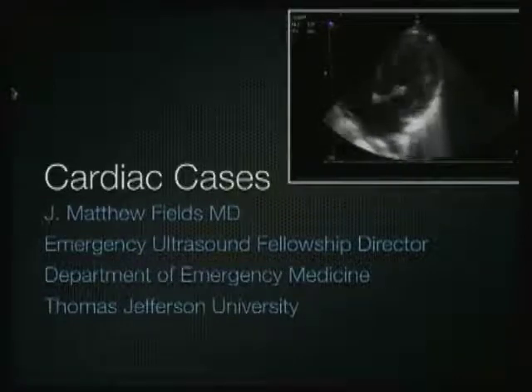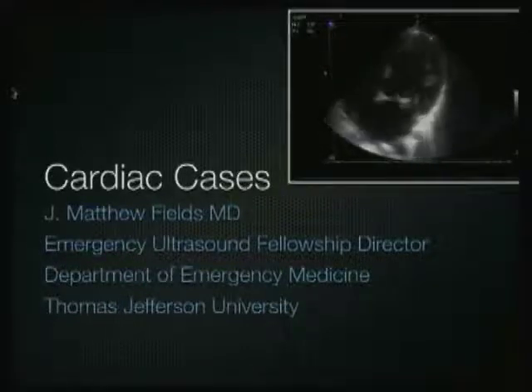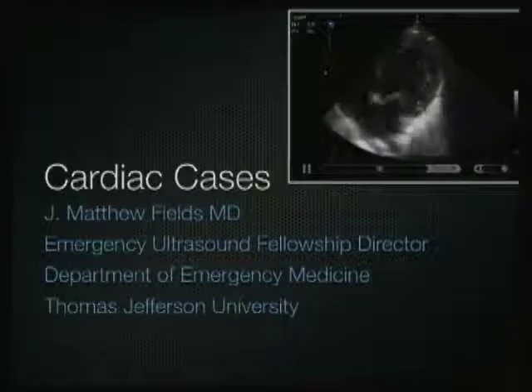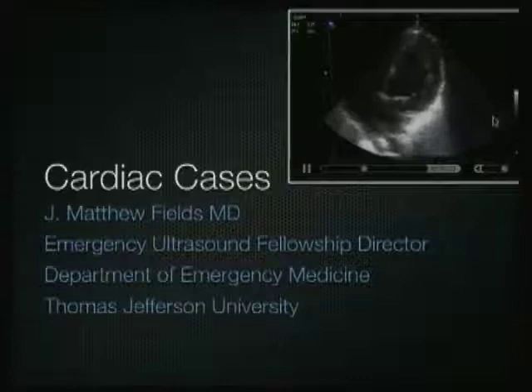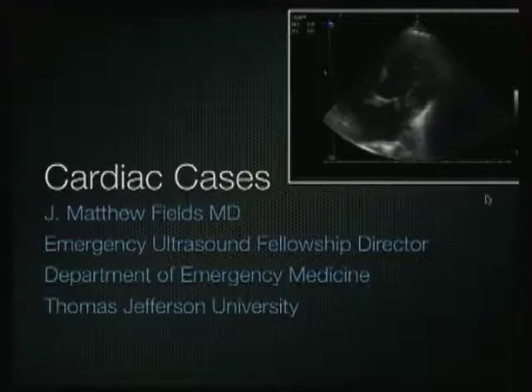For this example that I'm showing here on my title slide, just simply taking a quick look at this, hopefully you realize that there is something not quite right here, and you can see on the mitral valve a large hyperechoic mass, and this was a case of endocarditis. It's very, very easy to see.